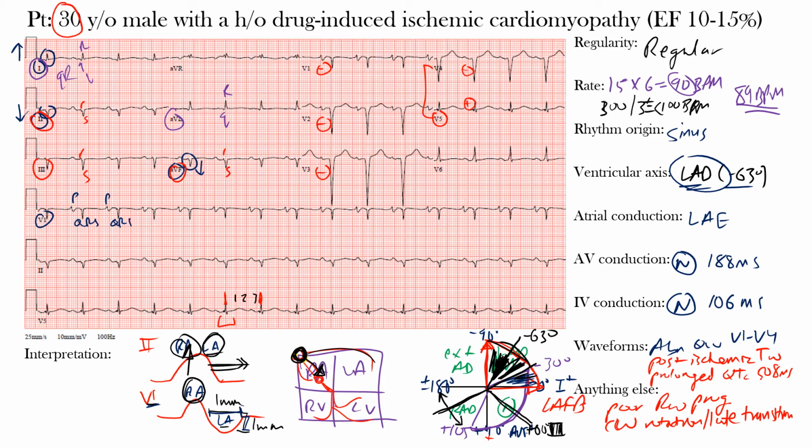Okay, so it's important to be aware that left anterior fascicular block can mimic an anteroseptal MI, which we believe is present here. And clinically speaking, left anterior fascicular blocks are more common than left posterior fascicular blocks due to the left anterior fascicle's smaller arterial supply and its thin bundle of fibers. In addition, isolated left anterior fascicular block is considered benign, although in some cases it may progress to bifascicular block with involvement of the right bundle branch, or even complete AV block.